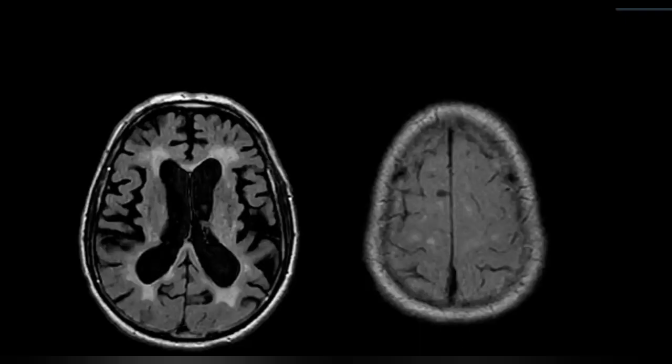So I gave you this image. There are many signs. I will tell you the two signs I use most. If we look here, the Sylvian fissure is big, all the sulci are big, the lateral ventricle is big. On this image, when I go to the surface at the vertex, I don't see that. So based on these two images, you can suggest the patient has NPH.